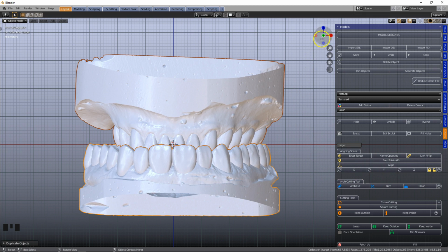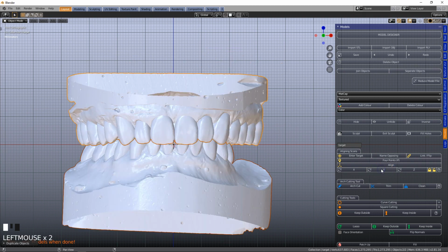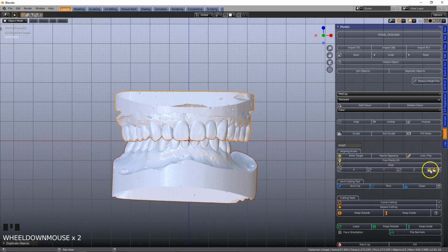You can see on the top widget the middle one is Y. So think of I, it's moving towards your eyes, you're seeing it in the front perspective, so Y, I. So we're going to click on it twice to rotate it twice at 90 degrees. Following this, you may lock the models, or you can just leave them as they are, as long as you don't move them around.